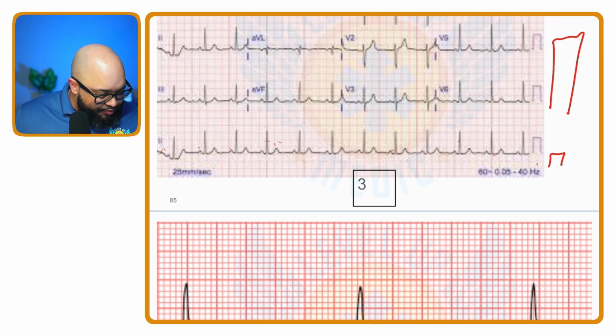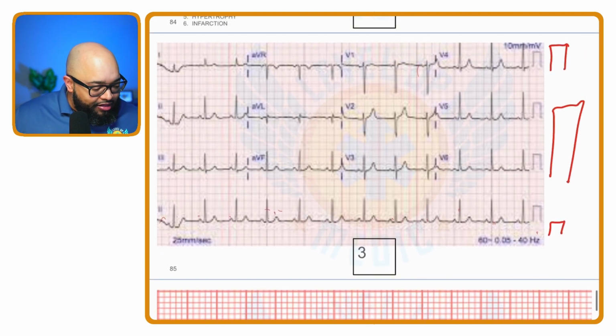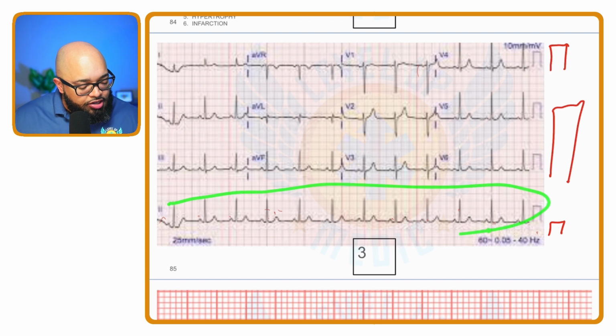Okay, now our next step. What's step number 2? We're always going to look at the rhythm. So we're going to check to see, do we have a P, QRS, a T? Is the PR interval normal? Is the QT interval normal? I'm going to go ahead and tell you, just for the interest of time, that it is normal. We check for step number 3, which is regularity, right? So we're going to look at this. I like to use this rhythm strip.